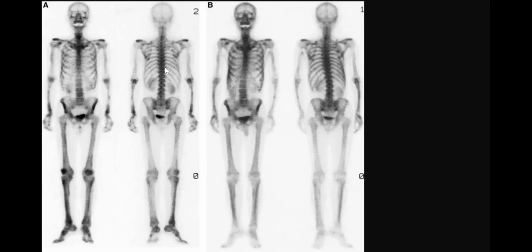Okay. What else? As you mentioned, linear or tram track uptake along the appendicular skeleton. This is very good description in a non-homogeneous or non-uniform pattern affecting lower extremity as well as upper extremity. Enough. Everything else is normal. So the diagnosis will be hypertrophic osteoarthropathy.